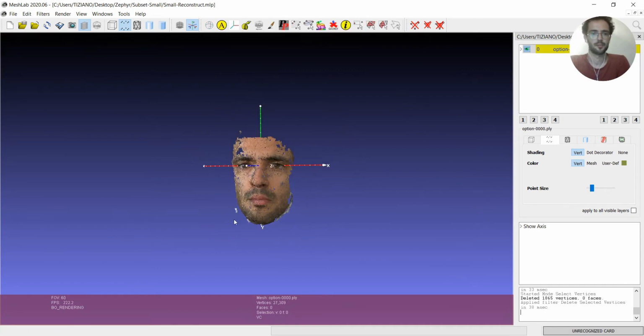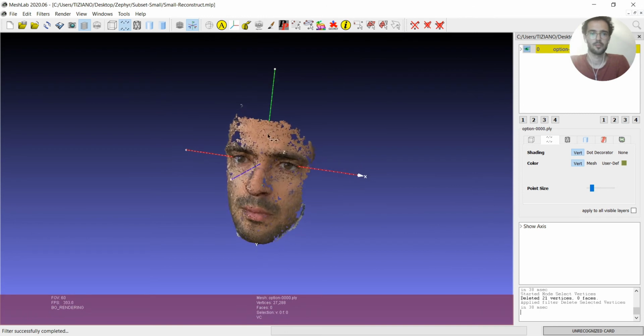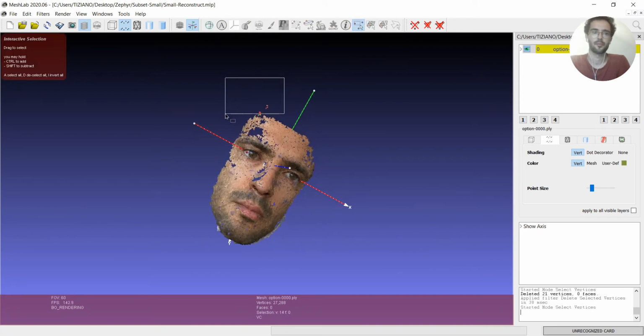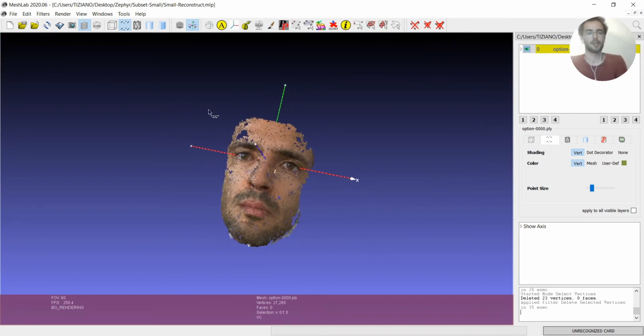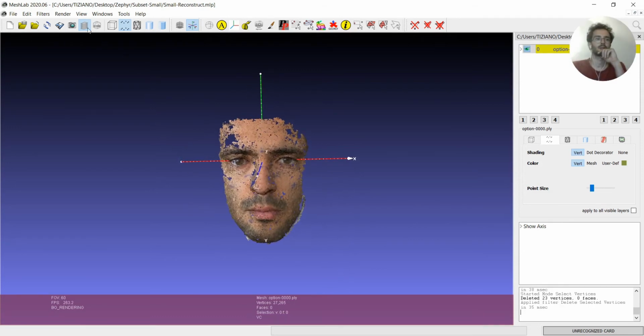Okay, better. And also these points. And this part here. Okay, nicer.